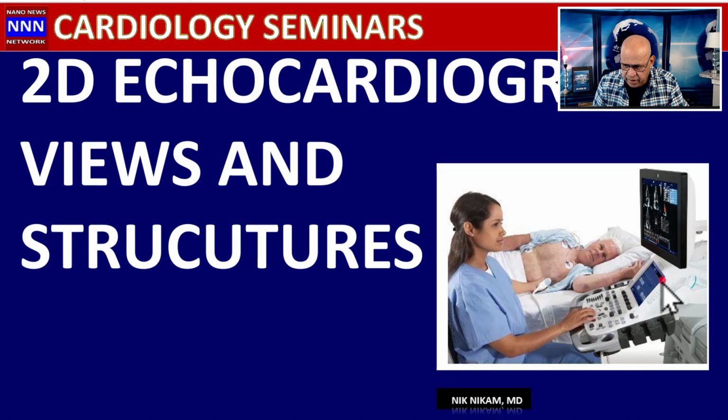And here's an echocardiogram machine. As you can see, we have a big monitor here. Then we have a control monitor where we can touch screen to change various parameters, and here are the various dials to input patient information. We can do 2D echocardiography, pulse Doppler echocardiography, and continuous wave Doppler. We can also study the blood vessels using a different transducer, where we can put the transducer here to do the carotid ultrasound test, which I used to do in my office.